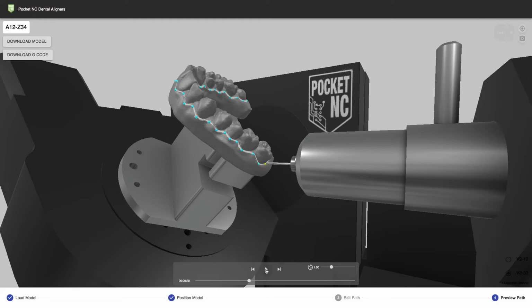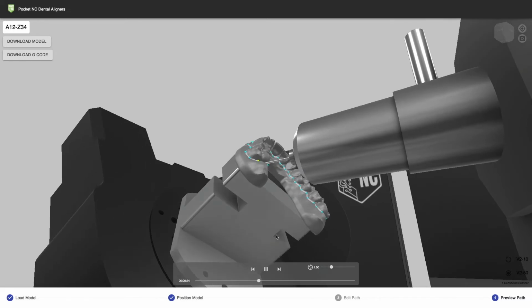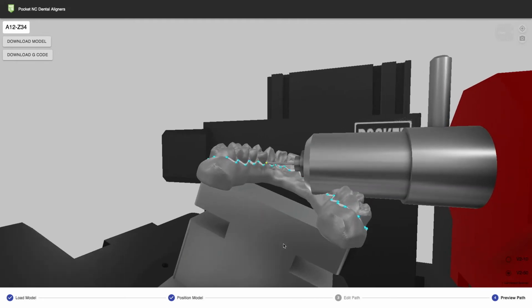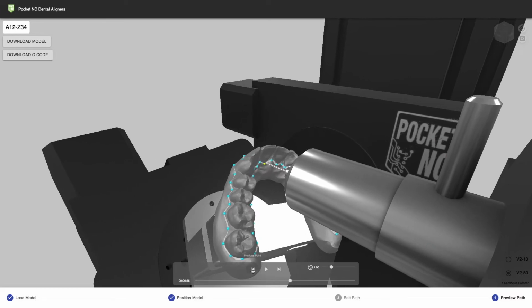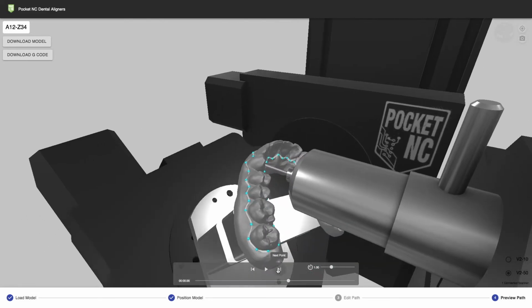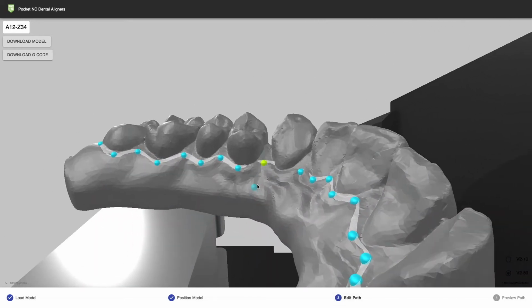The last technique we'll discuss is deleting a section of problematic points all at one time. So here we've identified a section that has issues where the spindle is at too shallow of an angle coming in to cut out the aligner. So we'll address that by going to the most recent point that's not good. And then deleting the several points.